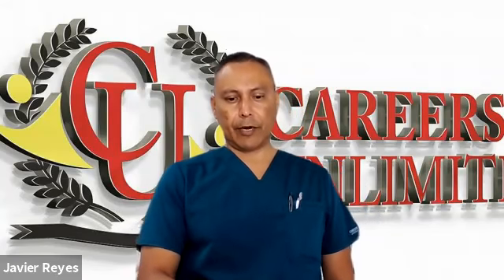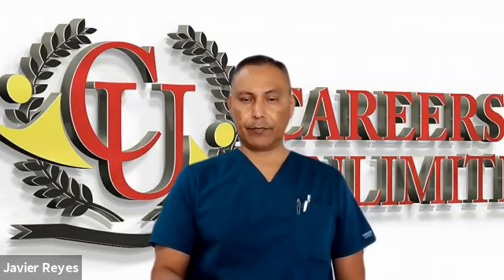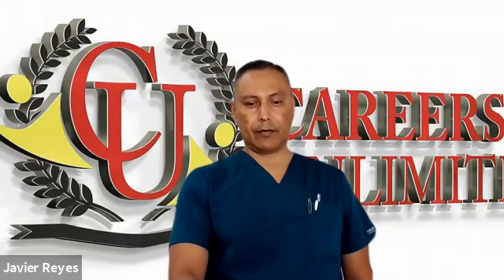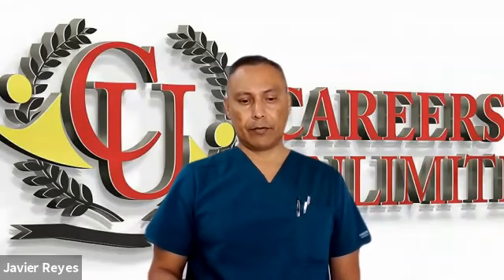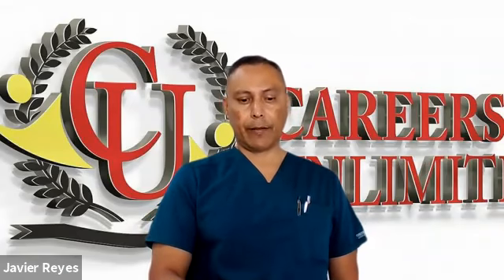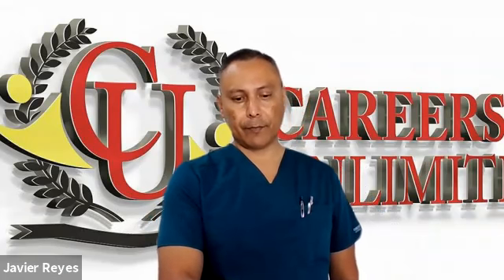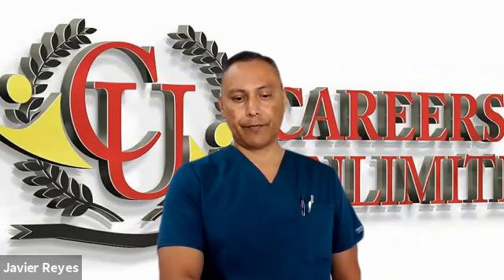Just by looking at number 18, is it left or right bundle branch? That one would be right. You see the right rabbit ears, right? 19 looks the same. Again, rabbit ears. 20, you have the QS wave, then your T. If you look closely at the P waves, I don't know if you can, but they look inverted.